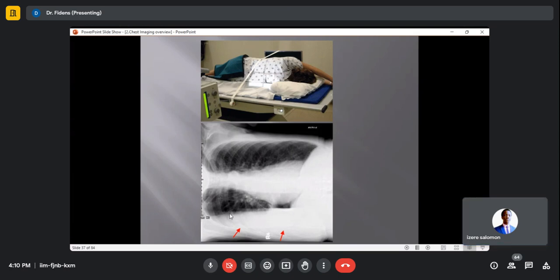That's the pleural space, fluid in pleural space, and you should see how it's very clear on lateral decubitus. This was enough to be seen in front of you. They just wanted to show how the lateral decubitus can be better in showing the pleural effusion. Okay.